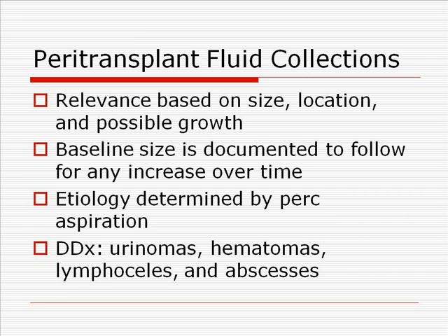The baseline size is documented because any increases warrant intervention, and it may be because of a urine leak, abscess, or vascular injury. The ultimate diagnosis can only be made definitively with percutaneous aspiration.